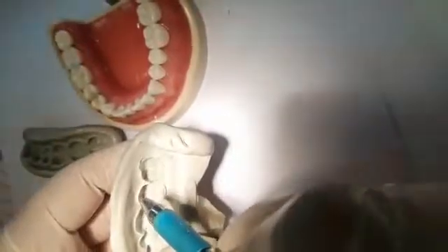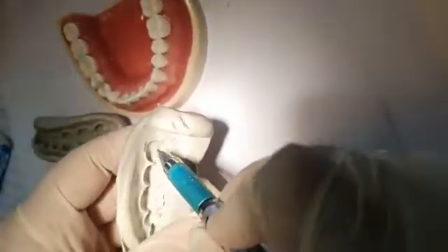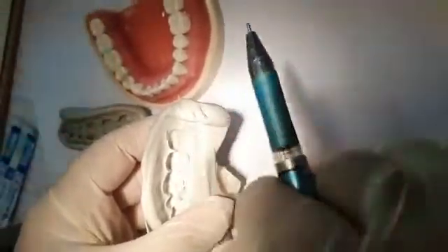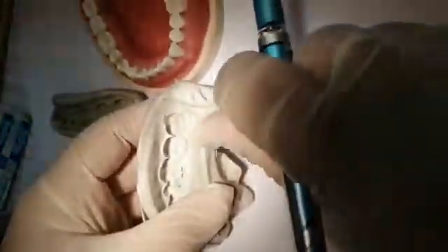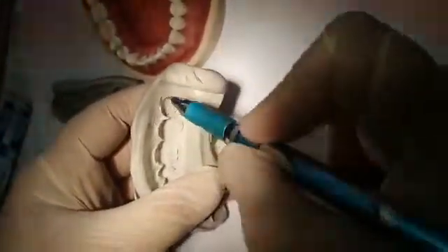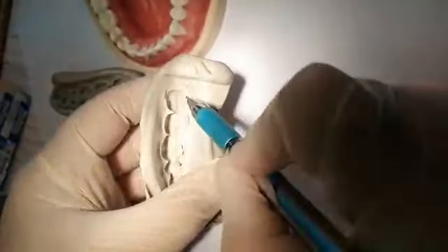Sometimes you even find these lines going like this. Even the track that the tooth went by is apparent. You will find it like grooves in the material. So that's a drag. What are the reasons for this? One reason is that the material might be insufficient. If it was insufficient, that means I don't have enough hydraulic pressure in the tray, so the tray is not pushing the material towards the tooth because the material is deficient. So either it appears as a bubble or it appears as a drag.